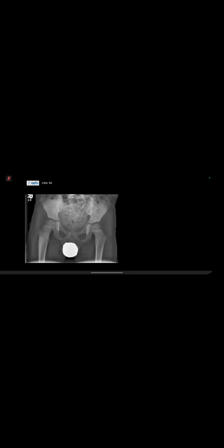Okay, good. The lucency, I'm not sure whether I'm overcalling, or is it a lesion in the femoral neck? Are you talking near the greater trochanter? Yeah, I think that's projectional. So tell me, what would you expect to see on the MRI?